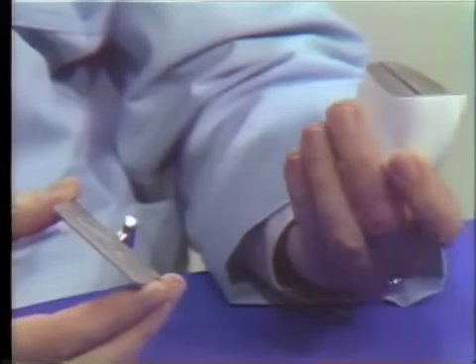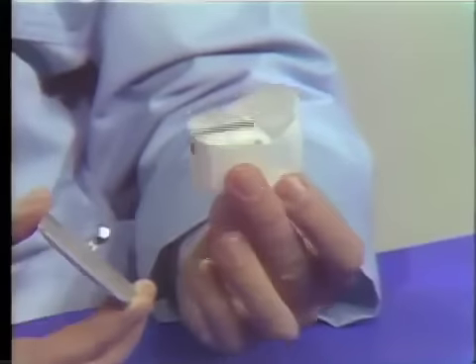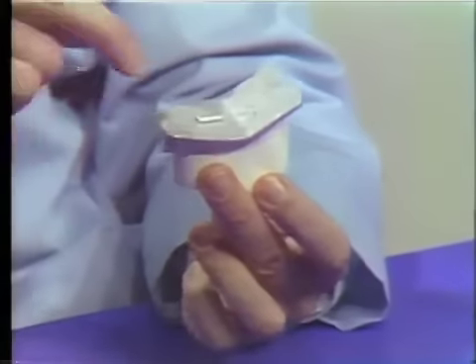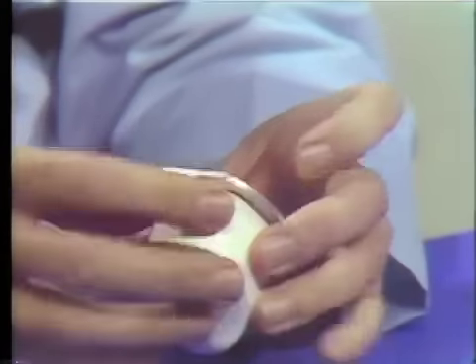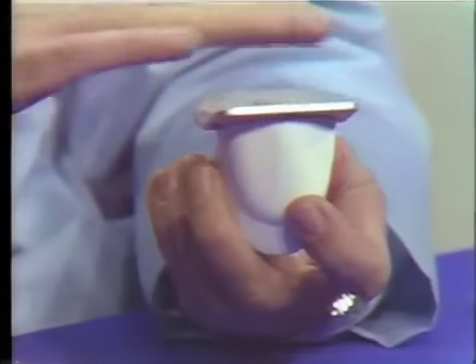It consists, in the case of a bicuspid Pontic, such as you see here, of the backing and the porcelain base. This is an enlarged model, of course. And again, this has to be ground and adapted on the fitting surface here and on the proximals and so on. And then when that's correctly designed, the top is cut down to the exact size, and the occlusal surface is then waxed onto the top here.